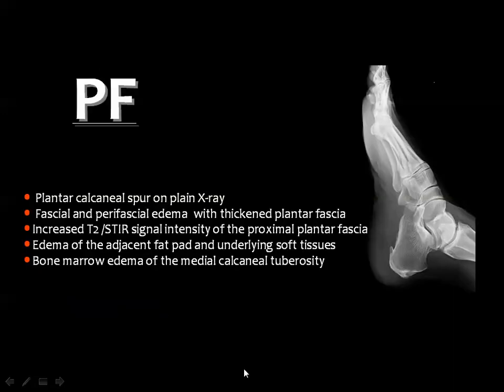And in the plain X-ray, you can see only a calcaneal spur. But this is not diagnostic of plantar fasciitis, since the calcaneal spur can be seen in asymptomatic persons and is not an indication of plantar fasciitis.